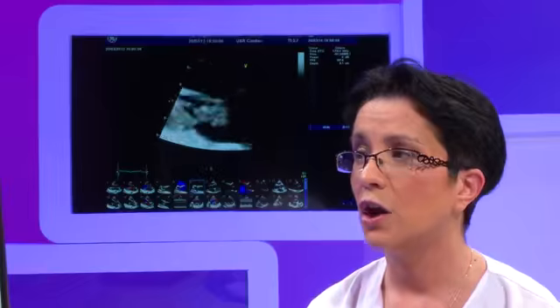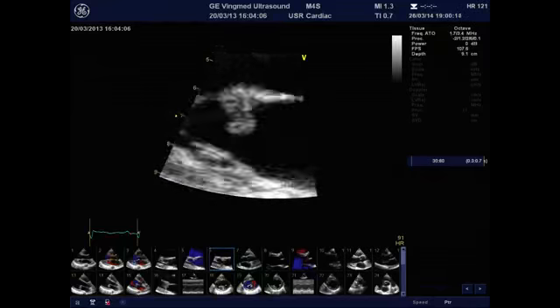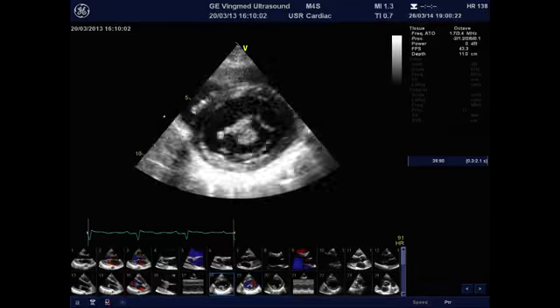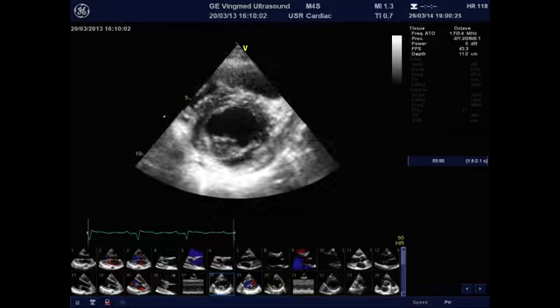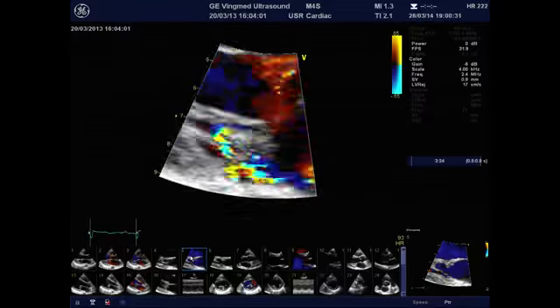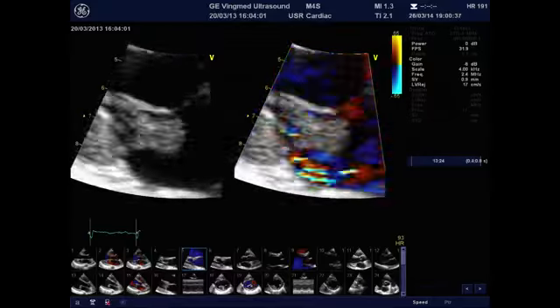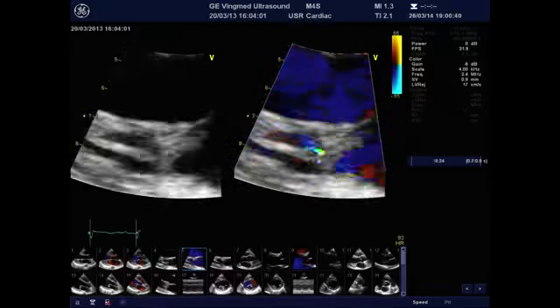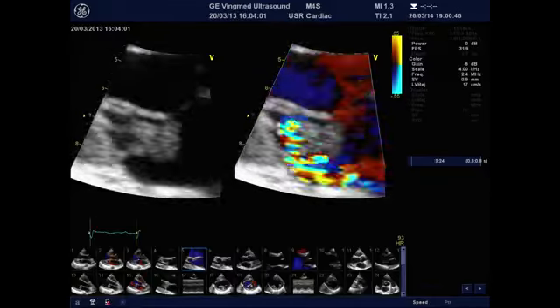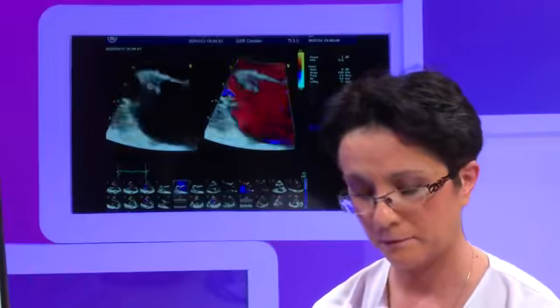And on her mitral valve, we could see a mass which was quite large. It was present on the anterior mitral valve, which was also nicely confirmed in short axis of the mitral valve. You see it is located on the middle scallop of the anterior valve, and it impeded the closure of the valve and gave, in this situation, significant mitral regurgitation. In this case, of course, we need to make a differential diagnosis between the Libman-Sacks endocarditis and an infective endocarditis, which can actually complicate the Libman-Sacks endocarditis.